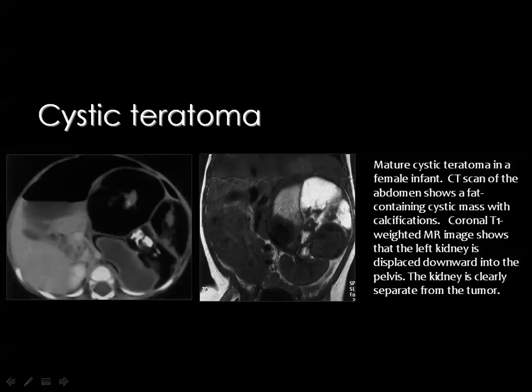And you know that these two major criteria, calcium and fat, can help to predict the nature of teratoma anywhere in the body. You remember in the mediastinum, and also in the ovary, when we will discuss the imaging of the female pelvis. One of the two criteria is helpful to diagnose ovarian dermoid cysts.